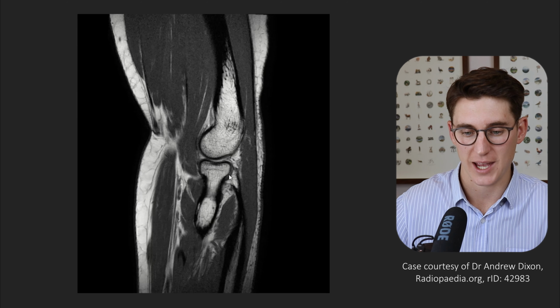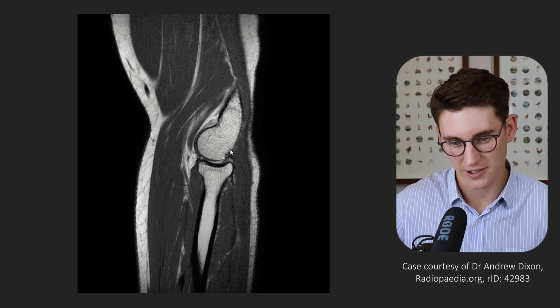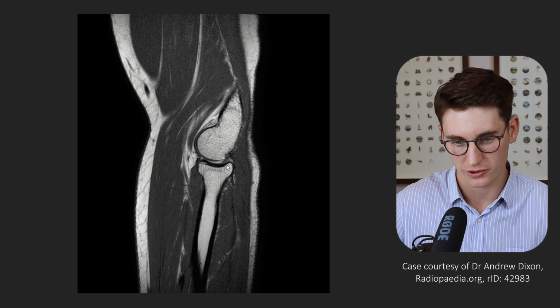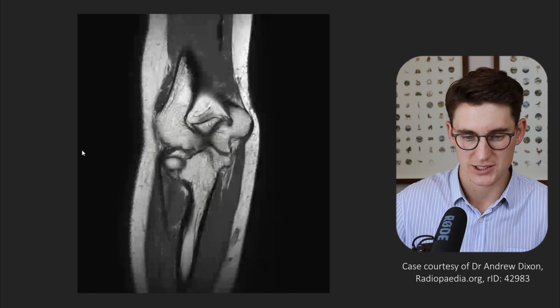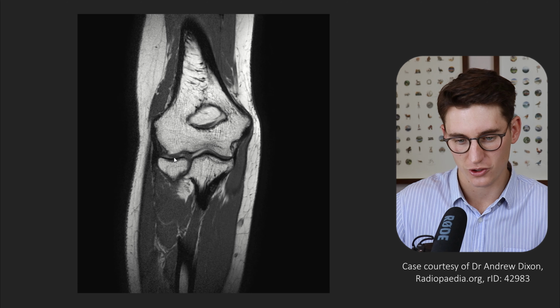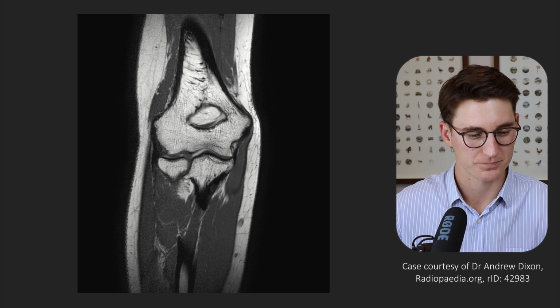Lastly, if we head out towards our capitellum, we can see our radial head here that articulates with our capitellum, and we can see the articular surface of this rounded part of the capitellum. We get a flattening out here at the posterior portion of the capitellum where there is no cartilage. That's completely normal. When we cut this in coronal, sometimes we will see radial cartilage and no capitellar cartilage. Let's see if we can see it here. Let me go posteriorly. See how we've got cartilage here on our radial head, but no cartilage here on our capitellum. That's normal. That's just the posterior surface. We haven't lost any articular cartilage on that capitellum.